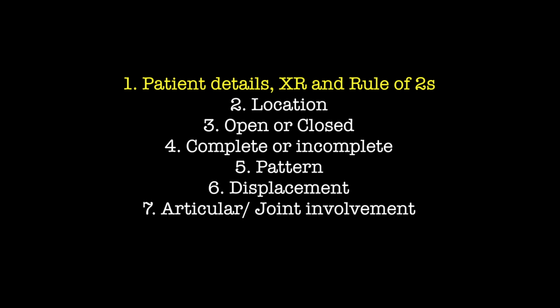patient's name, check the date of the X-ray, and make sure to apply the rule of twos. When describing the fracture, state its location, is it open or closed, complete or incomplete, describe its pattern and its displacement, and is the articular surface involved, and if yes, is there a gap, step up, or impaction?